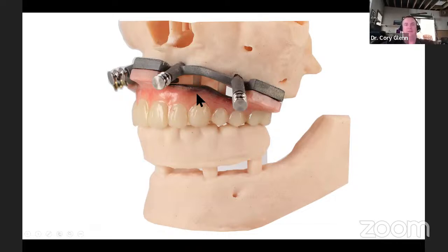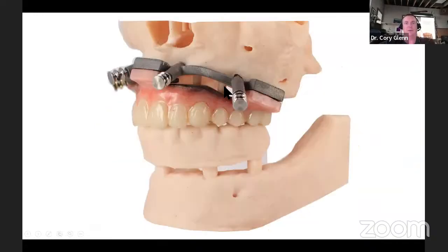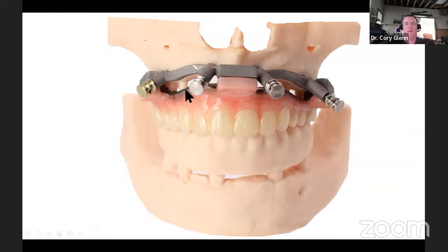Okay. And this hybrid, if you didn't notice, is designed to sit exactly 3 millimeters off of the bone. Remember, we know where the bone contour is going to end up, right? Because we're using a reduction guide to get it there. And you pretty much always want 3 millimeters of space from your bone to the intaglio. So I've got exactly that to the micron, 3 millimeters of space from the reduced jaw down to this highly polished intaglio of my temporary.